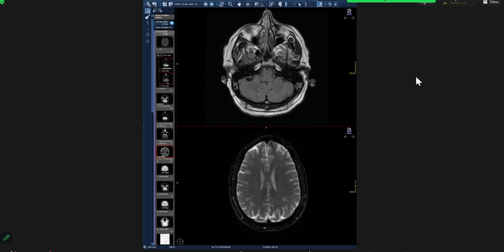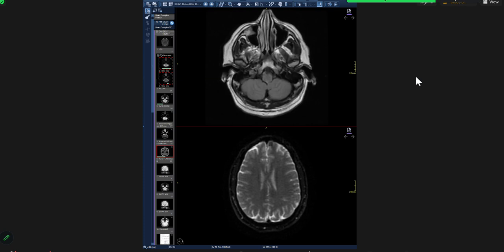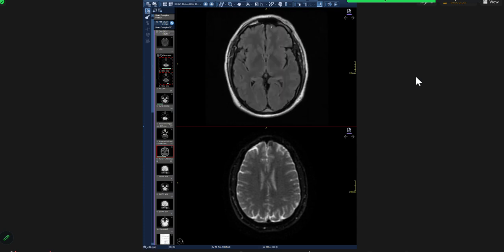In female patients, you could be thinking that it could be oral contraceptive use, post-cesarean, postnatal, pregnancy, puerperium. Then the prothrombotic conditions you have to always talk about, and always look at the local factors. That's why I was showing you this MRI head. I wanted you to comment on the mastoids, and you commented that everything here looks okay.